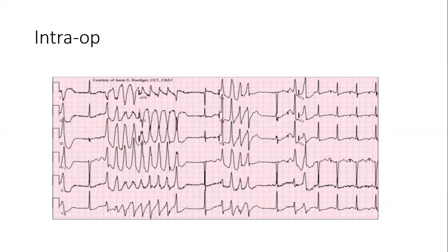All right, thank you. So just to go back a bit, the way the exam is set up, you will need to do spot-on diagnosis of ECGs. So this is what is called a Torsades de Pointes.